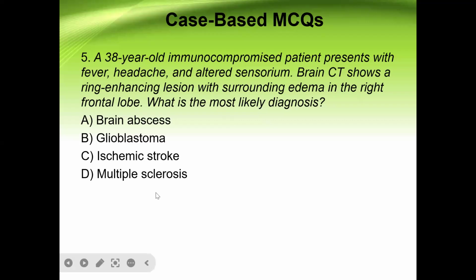Okay, who answers? Why is it brain abscess? Because of the presence of the ring-enhancing lesion with surrounding edema. Beautiful, you're correct. Which center are you from? LUTH. All right, LUTH is Lagos University Teaching Hospital.